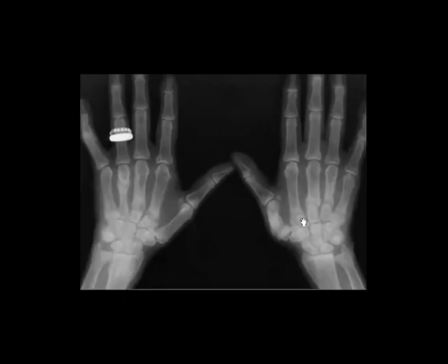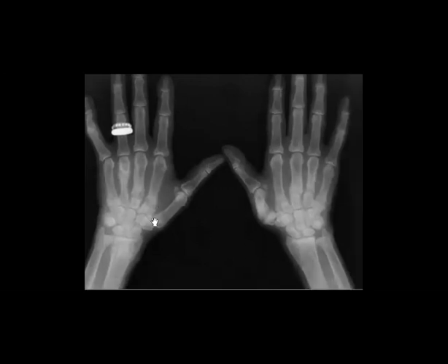For example, here the titles you get are that maybe there is some osteopenia and there are fractures, and these fractures are a bit strange for you because they are bilateral and maybe symmetrical, right? So now I think you will not think about trauma, because trauma is usually local and maybe in one hand.